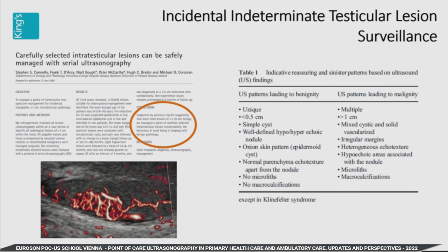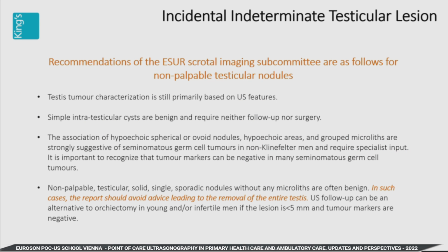So yep. In summary, I've shown you that using your multiparametric imaging for an incidentally discovered lesion in the testes, a non-palpable lesion, and this is important, can be managed very differently from the previous management of orchidectomy. And you can either do a testes sparing surgery to get your diagnosis, or you can do active surveillance quite comfortably.